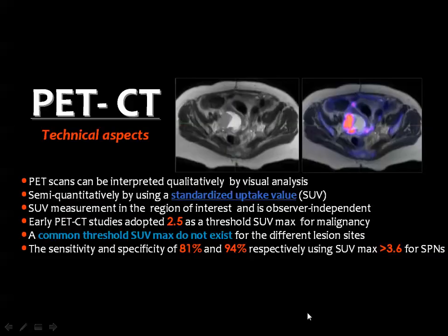Then the images of PET-CT are interpreted on the basis of the degree of uptake of the lesion by the injected isotope.